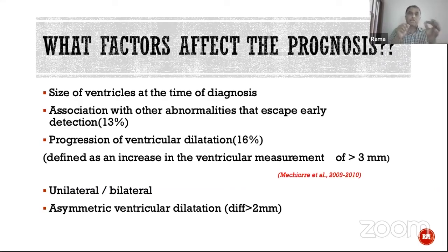So I know that it should be quite a long PO sulcus or calcarine sulcus. The cingulate sulcus should have made its appearance. The acute angle nature of the operculization should have come in, and the convexity sulci should have come in. So now I know if I ask at 26 weeks, I can expect answers as black and white on MRI.